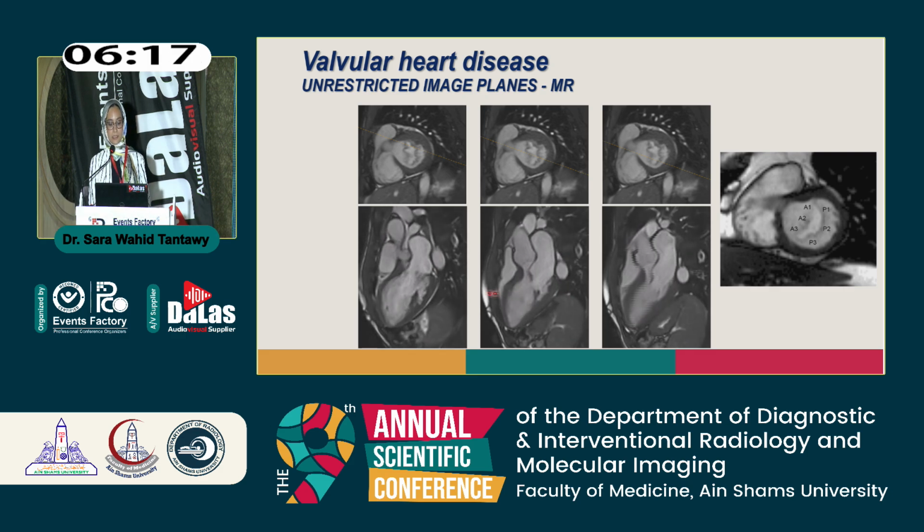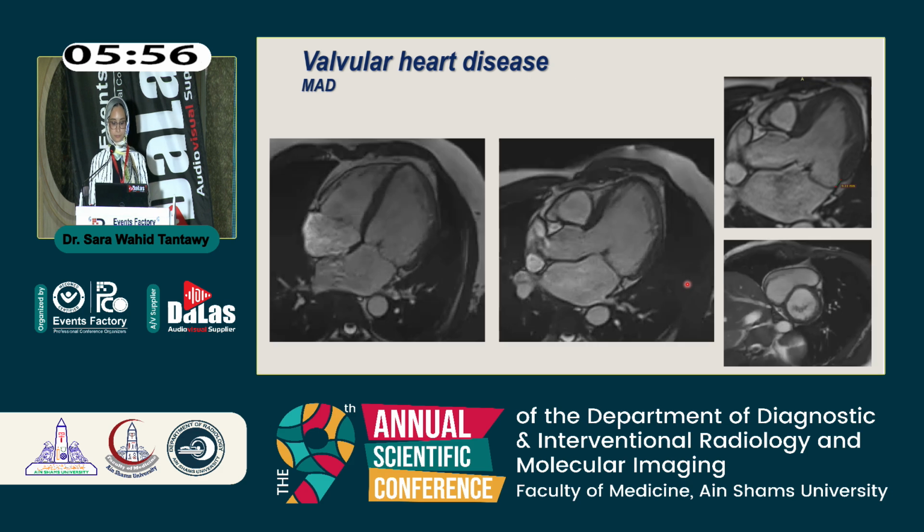And as you can see here, there is multiple scallop affections. So the first image over here is crossing between A1 and P1. The second one is A2, P2. The third one is A3, P3. And all scallops here are actually prolapsing above the mitral annulus plane. So this is a multiple or multi-scallop affection.